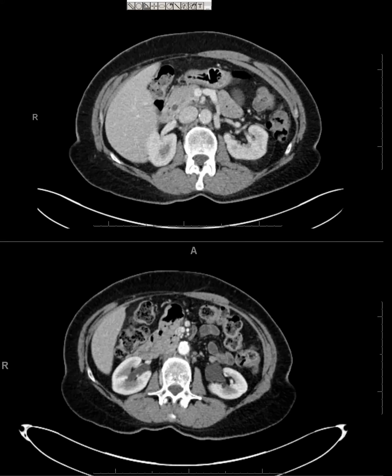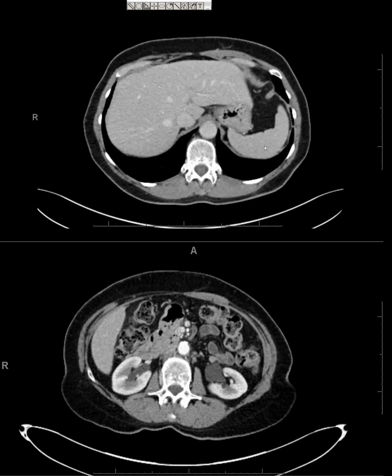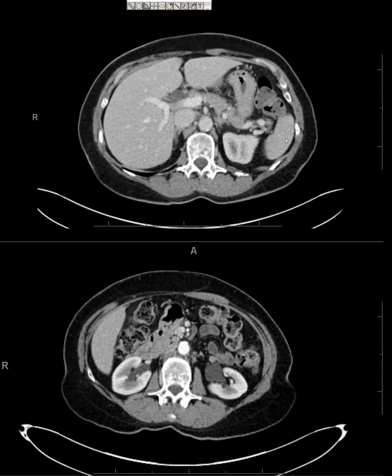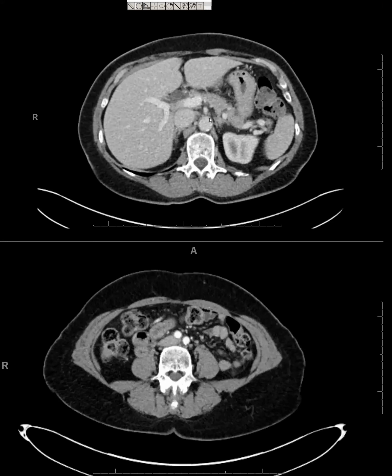An elderly patient that had intermittent symptoms of abdominal pain over like 10 or 15 years. And we were just looking at the exams trying to see if we could figure it out. This is the most recent, and this is the prior. The prior made mention of abnormal configuration of bowel loops.